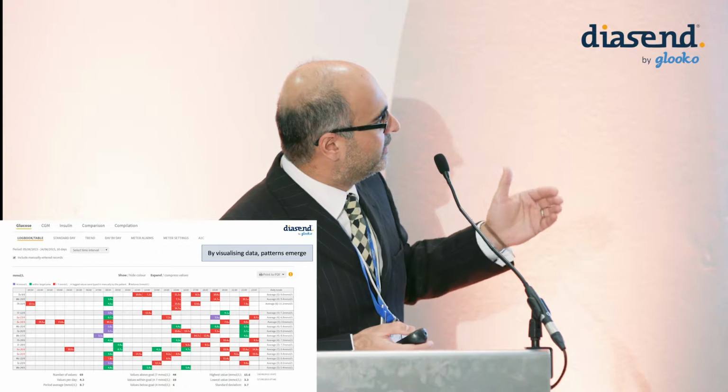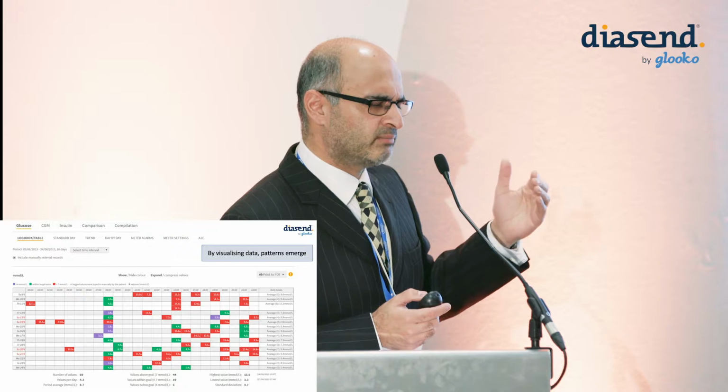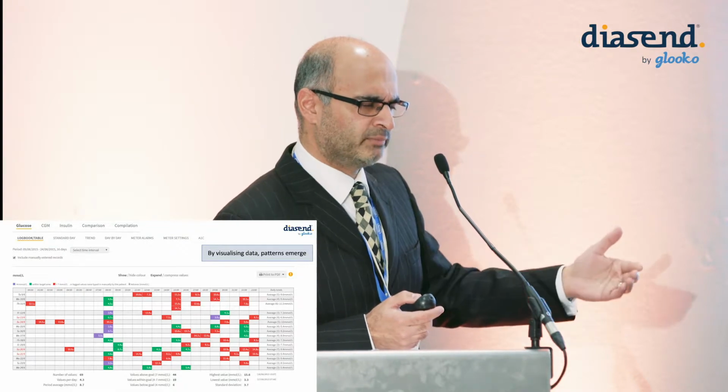What we have here is a download of something called diasend. Anybody using diasend already? Yeah, most of you are, good. So diasend, for those that don't know, is a sort of IT box of tricks which allows blood glucose data to be shared between the individual person at home with a specialist team in hospital.